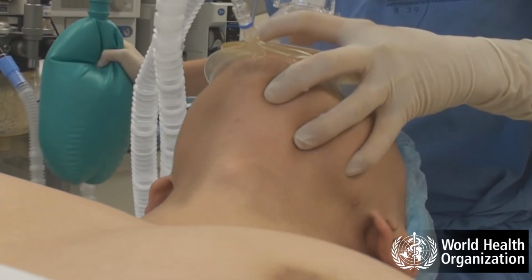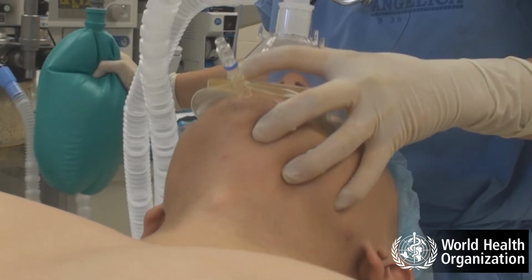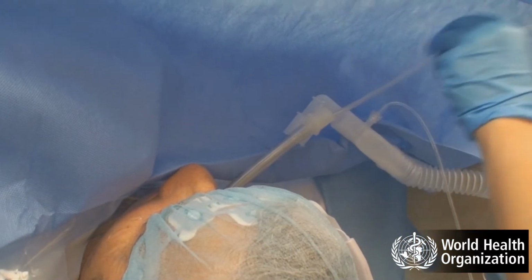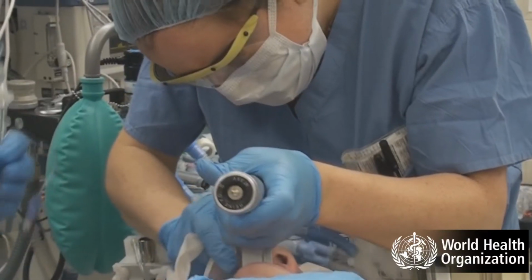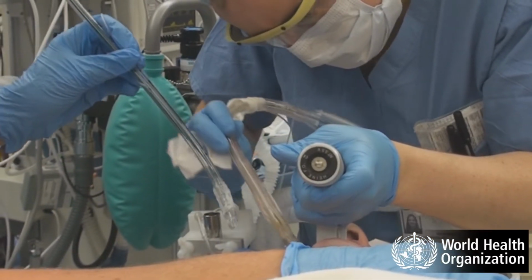Airway obstruction is a clinical diagnosis that requires immediate attention. Unrecognized, inadvertent esophageal intubation is a major cause of anesthesia morbidity and mortality. An intubated patient who has been previously well saturated may become hypoxic if the tracheal tube becomes displaced, kinked, or obstructed by secretions. Check the tracheal tube and, if in doubt, take it out.